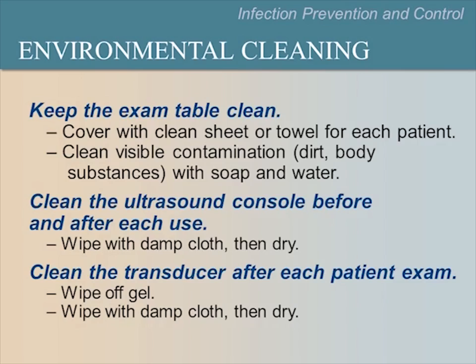In some areas, patient clothing, such as a large scarf, might be used to cover the table. Clean any visible contamination with soap and water. Clean the ultrasound machine before and after each use. Wipe the screen with a damp cloth or tissue and then dry. Finally, clean the transducer after each patient exam. Wipe off gel, then wipe the transducer with a damp cloth and dry.